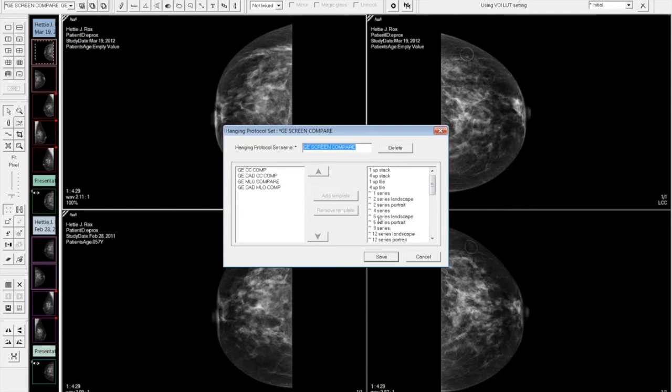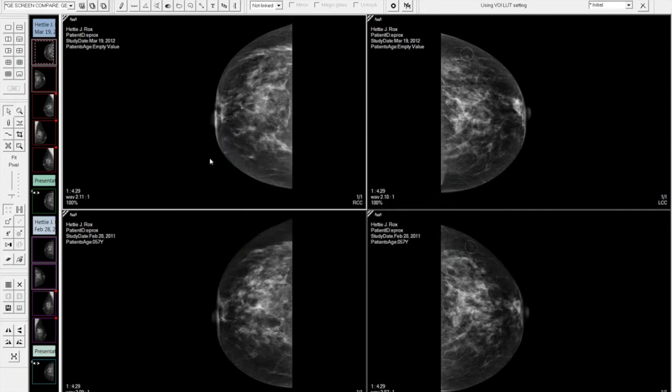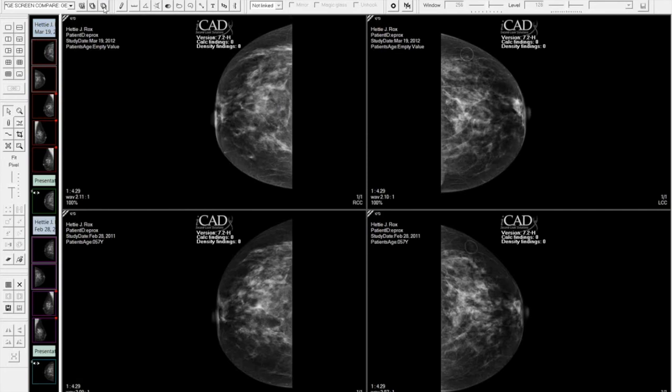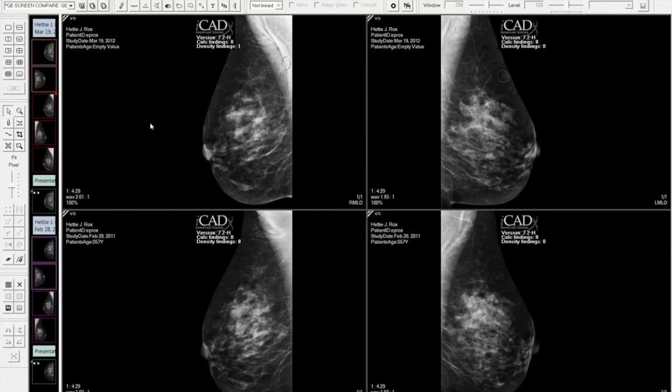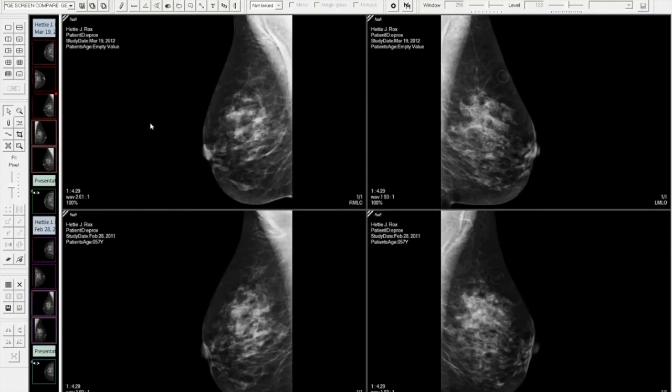You can add them, you can change sequences, I can put one in, I can take it out, I can move this one so that it happens in front of that one, I can rearrange the sequence of them, I can do all of the above. And then remember, I created a macro so that rather than having to go up here and click the button to change my view, all I have to do is use my arrow key, and I can step back and forth.